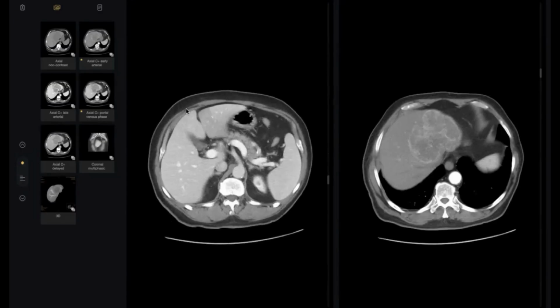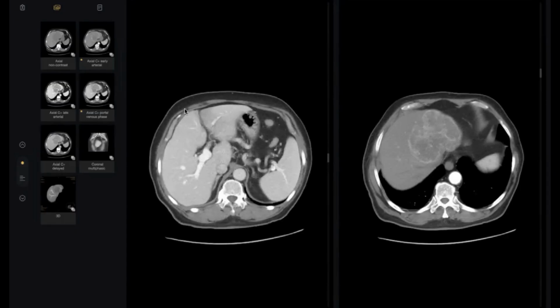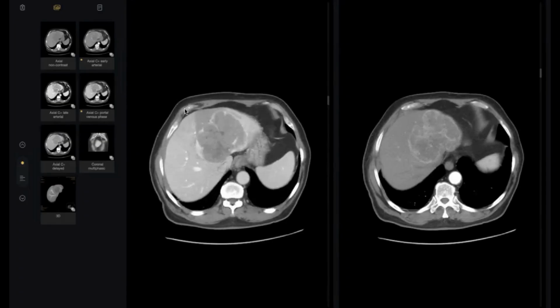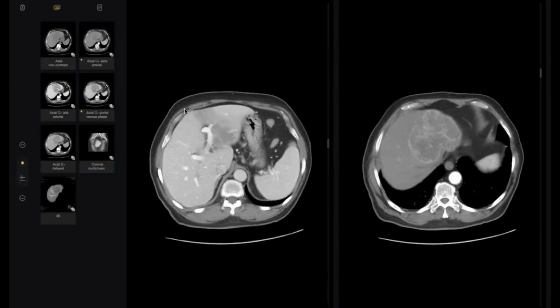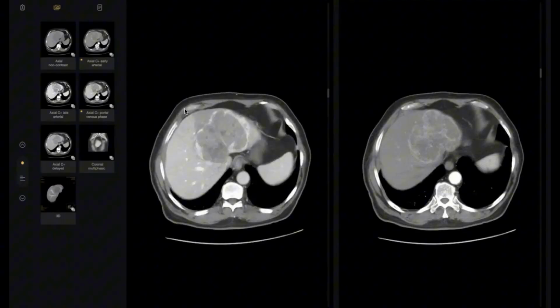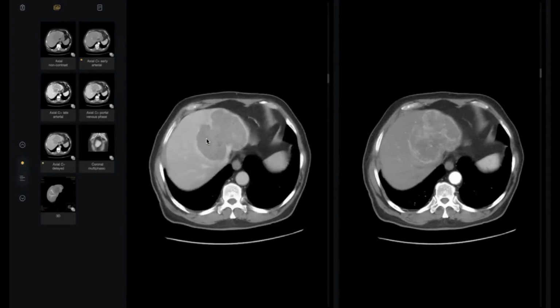The left hepatic vein is displaced by this mass. The left portal vein is compressed by this lesion. However, it appears patent without any definite tumor thrombus. The right hepatic vein appears normal. The left hepatic vein appears to be in the center.